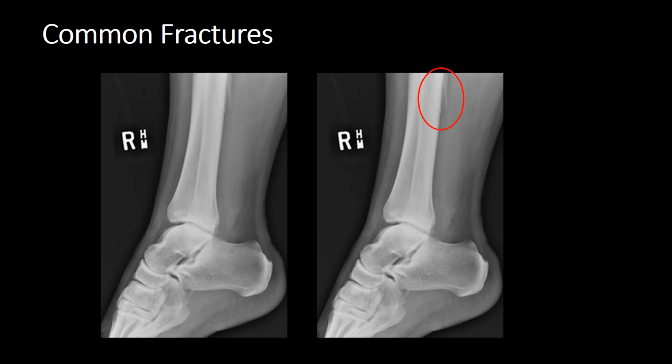And now on the lateral view we can just see this sharp piece of the fibular fracture. So you now need to have full-length tibia fibula views to be able to visualise the entire fibular fracture, and also make sure that you can clear the fibular neck.